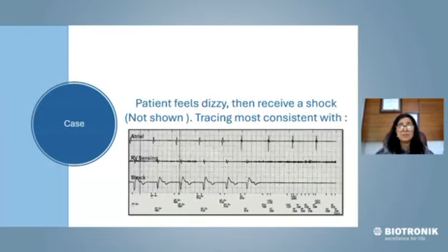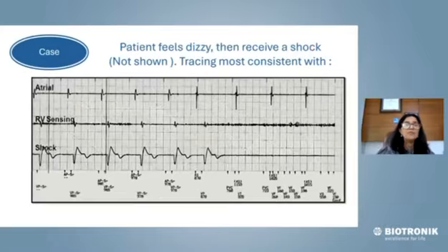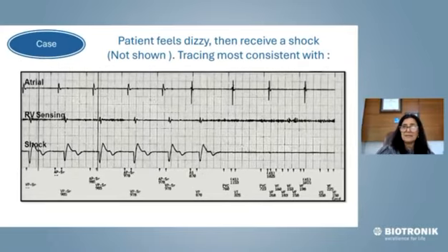Which brings me to some cases which I will show you. Here is a patient who feels dizzy, then receives a shock. Now, look into this EGM carefully. First, always see what EGMs am I seeing. You can see this is an atrial EGM. It's a near field atrial EGM.